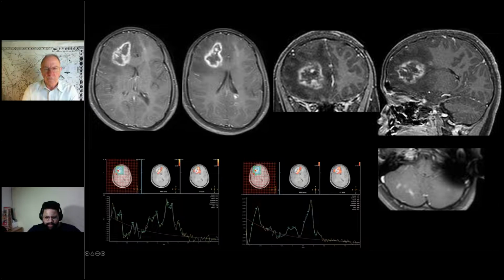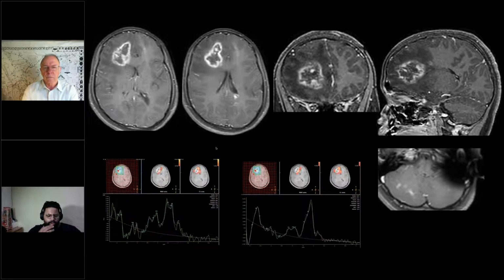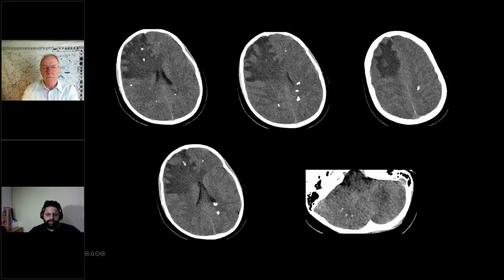Spectroscopy was done in the right frontal region and demonstrated a large lipid lactate peak. The rest of the peaks, I cannot find any diagnostic significance. Unfortunately, I did not look into this case clearly, but I would think probably an infection, at least of the lesions. They are probably abscesses or fungal lesions, though I am not able to explain the calcifications. The calcification appears to be more of a chronic abnormality. Is there any history of congenital infections or tuberculosis, prior tuberculosis, Dr. Kavita?